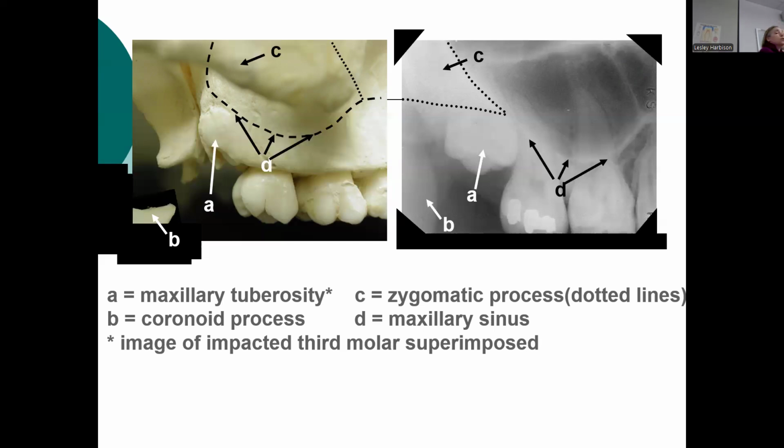That's what's down there. If you're looking at the picture, this one is an upper right maxillary molar shot, so it's always going to be down in the lower left. And if you're looking at the opposite side, it's always going to be down at the lower right. It's always going to be down by the most posterior molars of whatever shot. Whether you're on the right side or the left side, it's not going to be closer to the premolar areas, more anterior. It's going to be the most posterior corner on the bottom. That's where you would see the coronoid process.